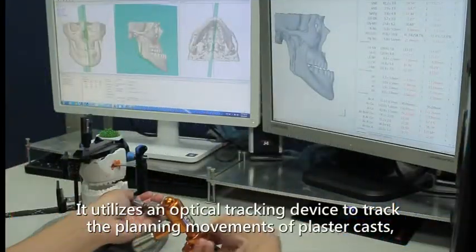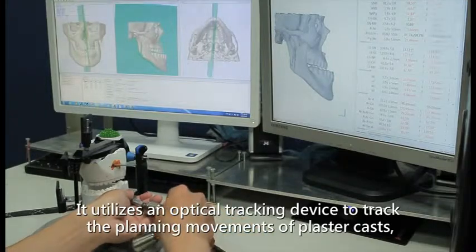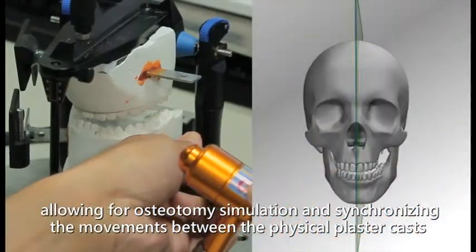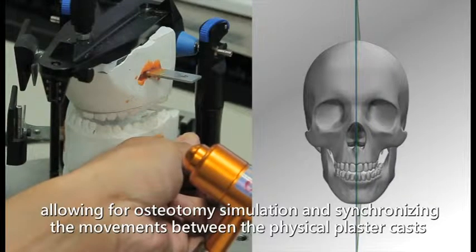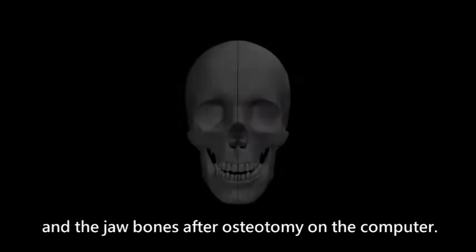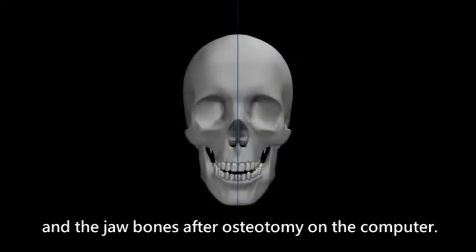It utilizes an optical tracking device to track the planning movements of plaster casts, allowing for osteotomy simulation and synchronizing the movements between the physical plaster casts and the jaw bones after osteotomy on the computer.